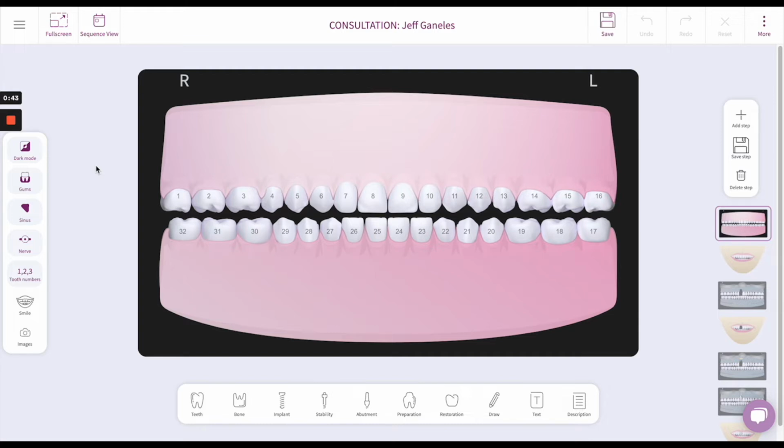So having visual tools like this that are flexible, that can be personalized, and can be very simple, non-threatening, and very fluid become a very useful part of our practice. I want to briefly show you some of the things that have been built into this software to give you an idea of what the capabilities are. This is an infinitely flexible menu-driven tool that has all of the options you need directly on this front panel.